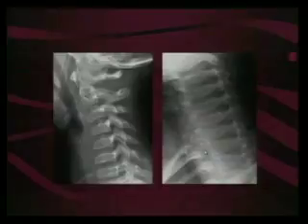Dr. Martin, can you go back to that initial film of that case, the lateral view? Yeah, that one. It's kind of weird, the lateral view, it's just positioning or something on the left side. Yeah, she's lost her cervical lordosis. The thing with pedicolaminar fractures, you're not going to see them on the lateral. That's why I keep pounding in oblique views. You're only going to see them on those, or the AP. As bad as that fracture is, you don't see it on this one. It's right here though. See how that's off? See how this is flowing?